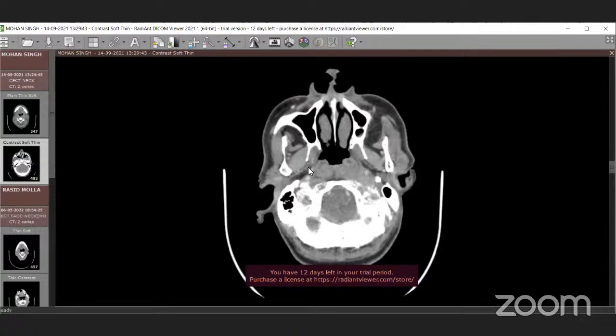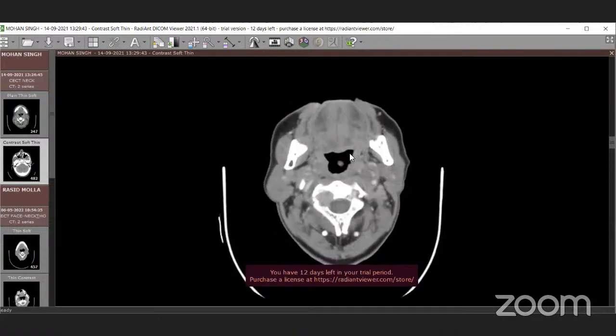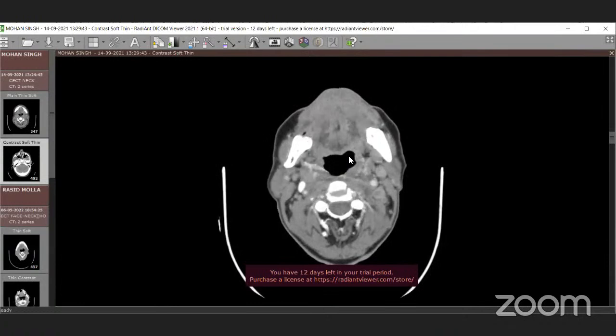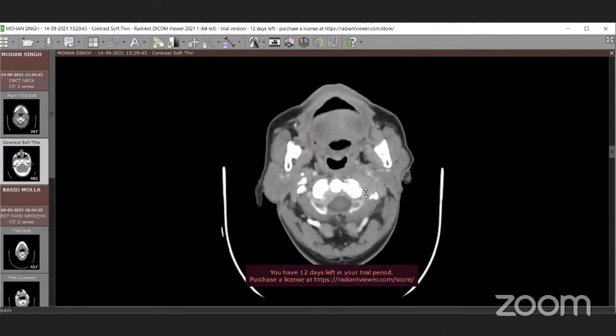Okay. Thank you. And next we move to the base of the tongue then. So the base of the tongue is bounded anteriorly by the circumvallate papillae. Already Dr. Shonak has told this in the first class. And next is inferiorly by the vallecula and epiglottis. Now it's up to you. So should we include the vallecula and part of the epiglottis along with the paraglottic and pre-epiglottic part?